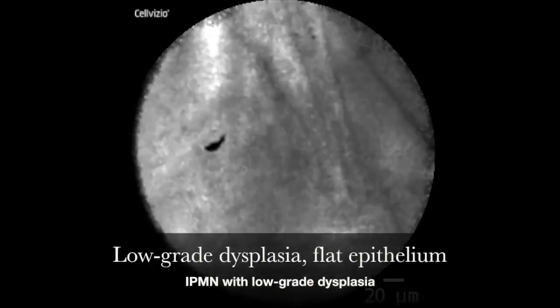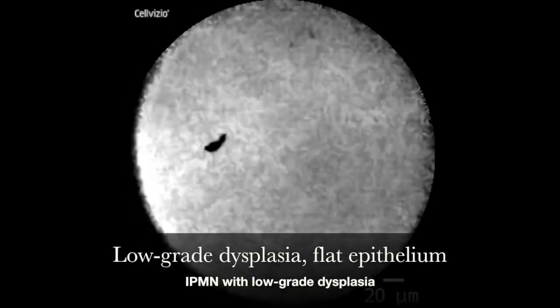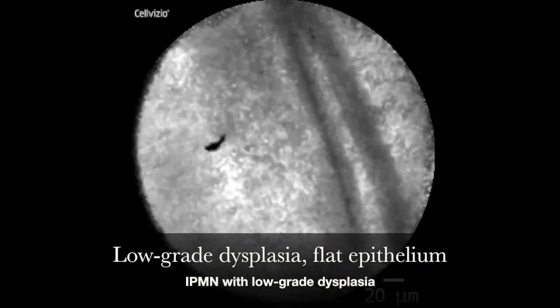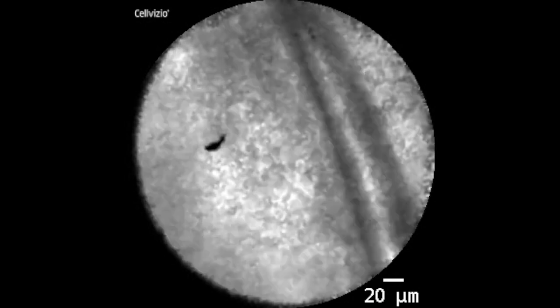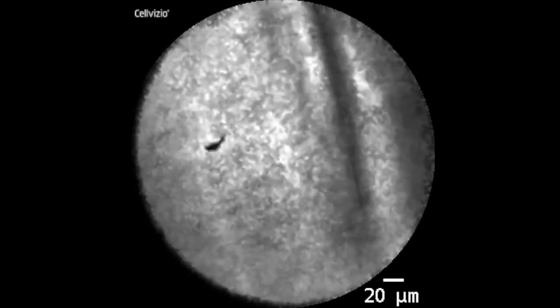Now here is IPMN in comparison. You see that this is an IPMN with low-grade dysplasia. You see layering of epithelium, and there is some type of papillary configuration, but you can hardly differentiate. But there are hardly any inflammatory cells in the background, and you never ever see this dark background with bright particles, which we see in MCNs.